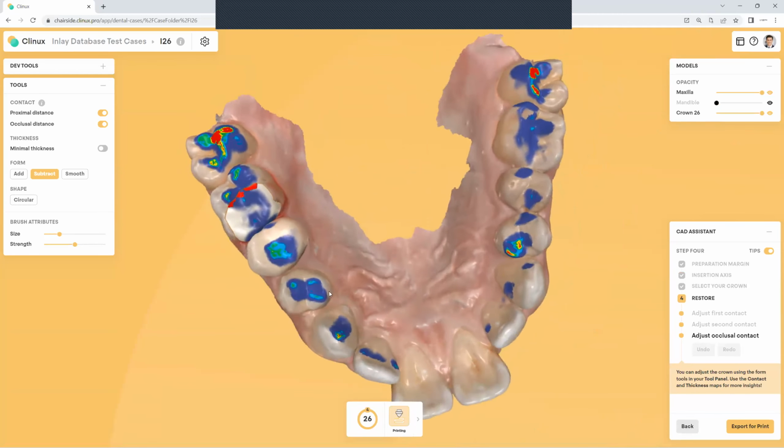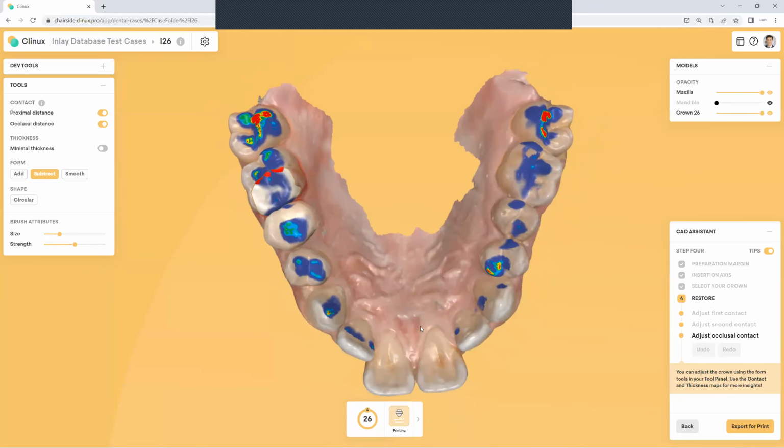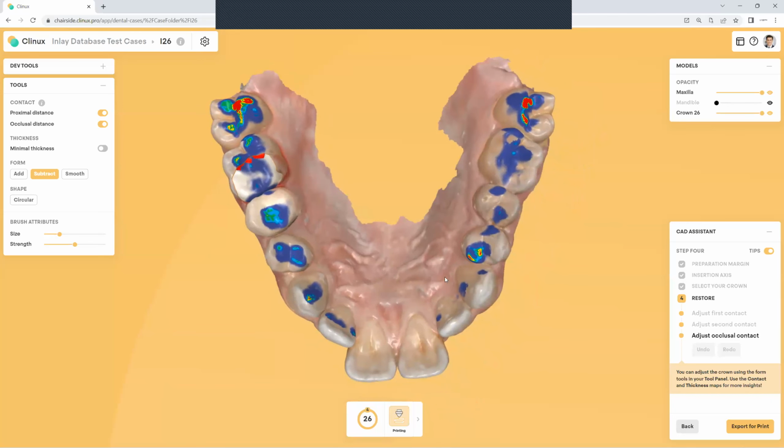Many times, since I'm opening cases all day long, what I often see is that you've got red and yellow and blue and red, all the colors over here, and then over here all you have is kind of light blue. Yeah, no red at all. And that tells you that the bite was taken on one side, but not taken again on the other side. So when it comes to full arch, and that's always the case with splints and night guards, make sure you've got 2 bites to stabilize those contact patterns. So I hope that answers your question.